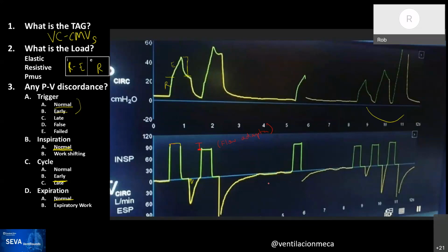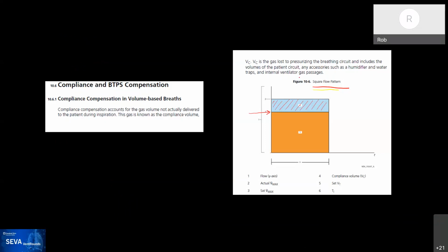No, I don't think that applies here because in volume control on the PB machines, you set flow and you set tidal volume, and that sets the inspiratory time. Now, the choice between a display of IE ratio or of inspiratory time is configurable, but you can't set it. You can't make this ventilator have a set IE ratio. It doesn't work that way.